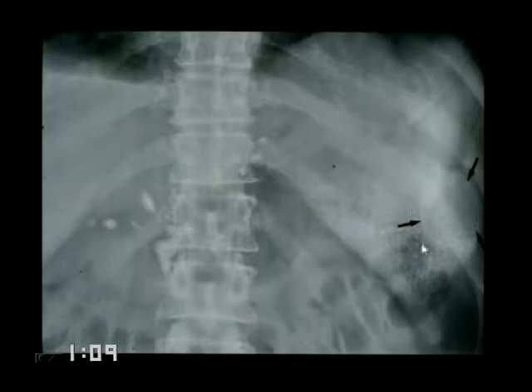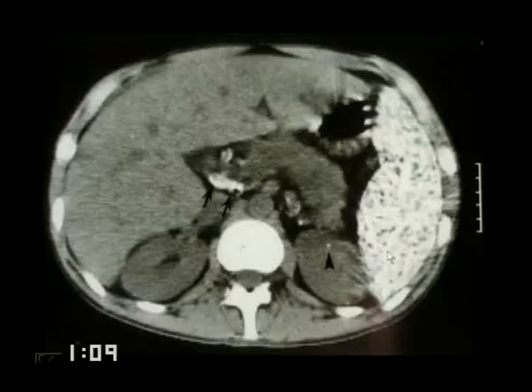And here you can actually see that the mottled pattern of the spleen is interrupted on the plain film enough that you could suggest that there's actually a space-occupying mass, which was a malignant vascular tumor in the spleen. This is a case courtesy of Randy Radden that was subsequently published.